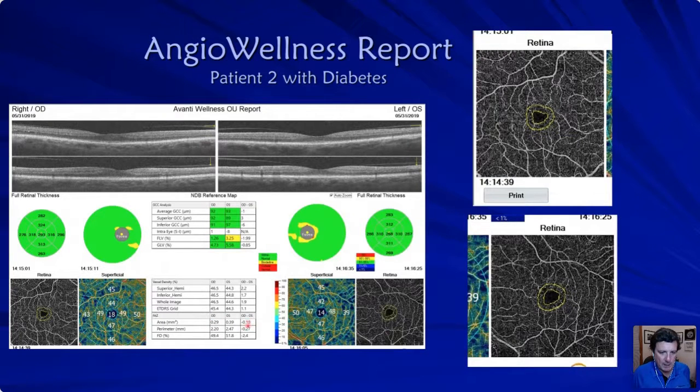It's a 0.10 difference. Let's go look at them. They're both distorted, but disease is usually a little bit asymmetric. So that's the good news. You've got to be careful with that. You always got to look at the scans because maybe they're expanding at the same rate and they're not going to be a 0.1 difference. In this case, it worked out. But look at the diabetic retinopathy in this eye and look how that foveolar avascular zone is being distorted.